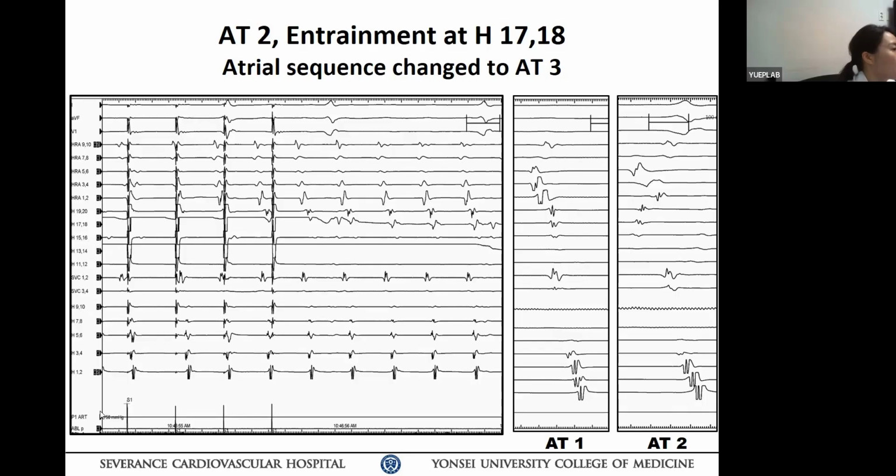We skipped many steps before measuring the PPI and TCL. But as we saw in this case, if the patient has many structural changes, substrate, sometimes even the same macroreentry tachycardia changes its circuit. So that's why there's a real difference.